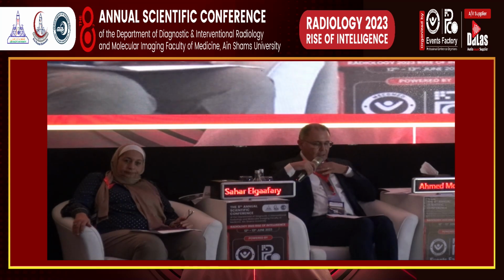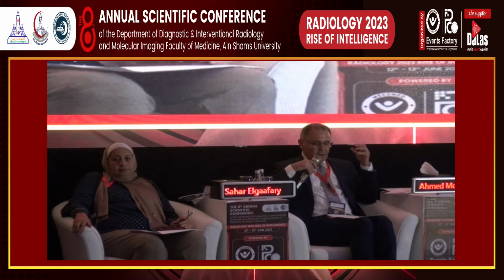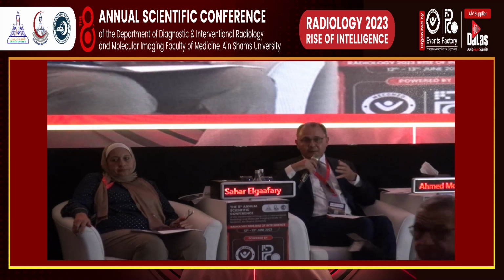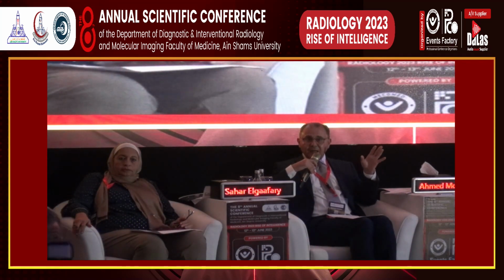اوكي، إحنا عارفين البريفرال زون المين بال سيكونس هو الديفيوجن ستادي، وكان بي موديفايد باي الدايناميك كونتراست إنهانسمنت. اوكي، طب في الباي بارامتريك أنا ما بعملش دايناميك، فأنا بعتمد على قد ما أنا فهمت بعتمد على الديفيوجن فقط في البايريتس، صح؟ تمام. اوكي.